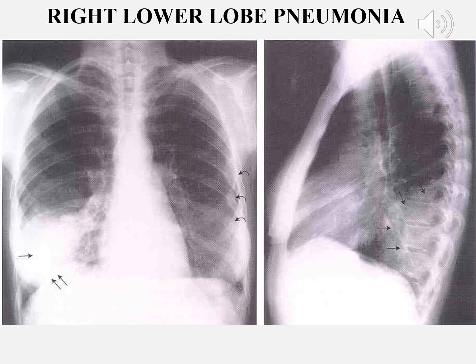Recall earlier when I told you that the right main stem bronchus is a little more vertically oriented than the left, so that makes it easier for aspiration pneumonia, aspirate, foreign bodies, things of that nature, just because of the way gravity falls, and these objects will go down the right main stem bronchus more easily than the left. So you typically will see some aspiration pneumonia, more so on the right, but not only. You can see it in the left lobe as well. Foreign objects, small coins inhaled, safety pins, things like that generally are going to go towards the right side.